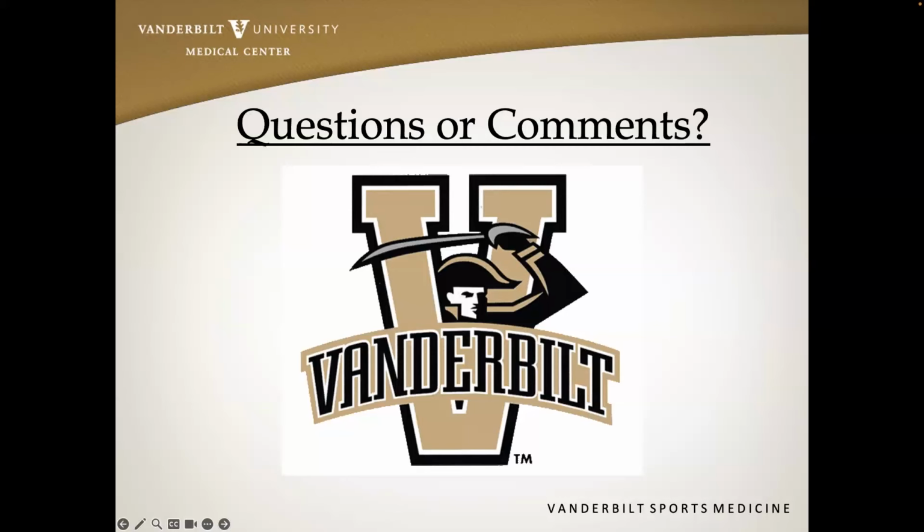But obviously, one difference that you're going to see in the older population is that the tendon is going to fill in where the non-ossified cartilage was, but they can still continue to have some of those cortical irregularities. But that's where I think, especially for the anterior knee and patellar tendon pain, it is so helpful to be using the ultrasound to correlate with the sonopalpation if they're actually having symptoms at that area, or was this a previous condition that they may have had, or are these just adaptive changes with their sport.